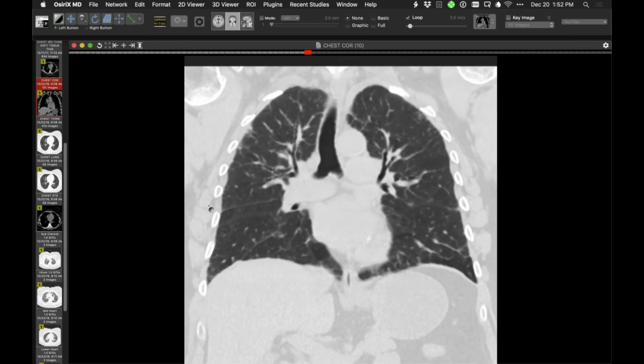And despite the fact that the lungs were pretty clear, and I didn't see anything that looked like plexiform arteriopathy or any other sort of ground glass abnormality, the diagnosis is surprisingly pulmonary capillary hemangiomatosis. So that case is actually more interesting than just the finding of the coronary sinus dilation, that little aneurysm thing. It's actually a case of PCH, despite the fact that there's nothing distinctive on the radiology about it.